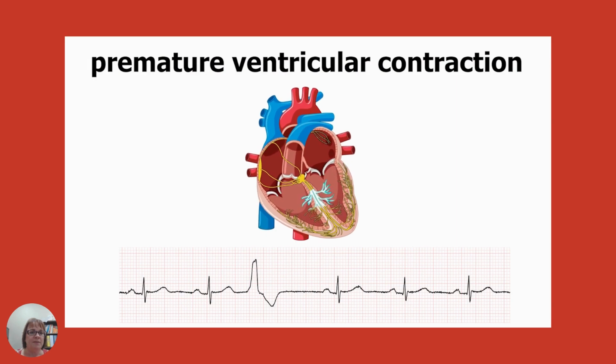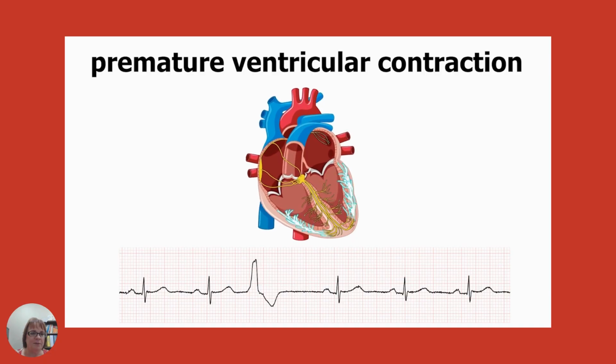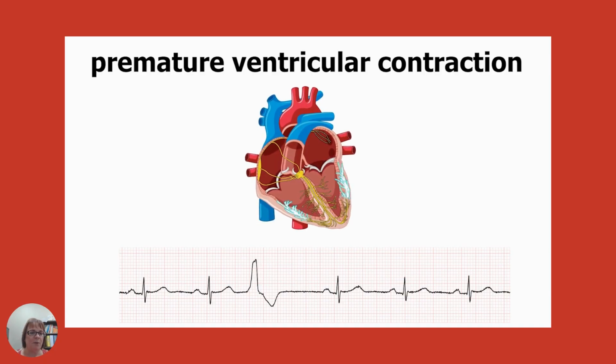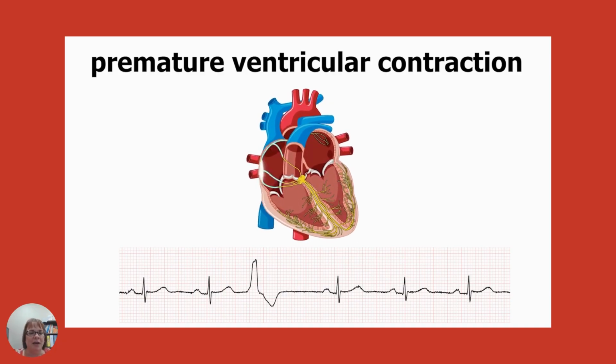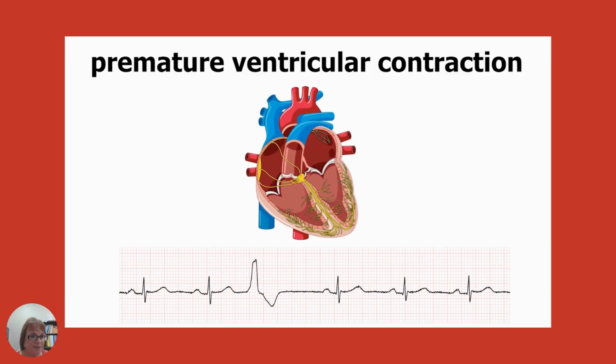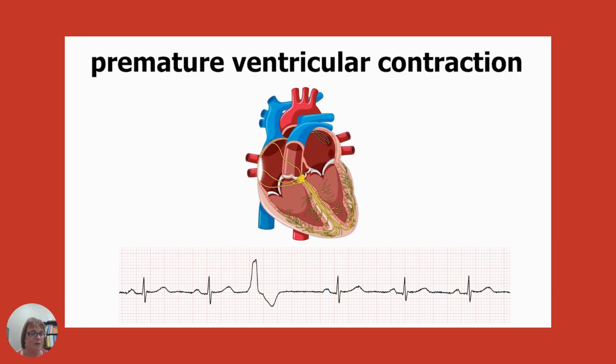This is PVCs. What happens is the heart, as it's beating, sometimes the ventricle gets excited and pumps all by itself, but it didn't fill up totally with blood, so it's just kind of working on its own. A lot of patients that have PVCs, that can be related to energy drinks, too much caffeine, or electrolytes, especially their potassium, calcium, or magnesium. They could all be either too high or too low.